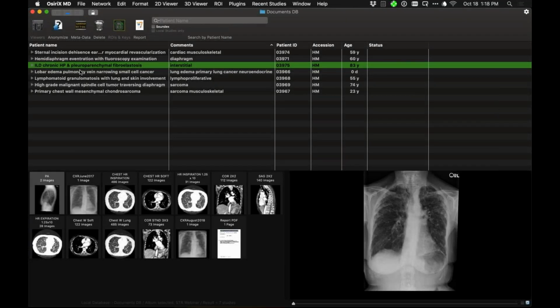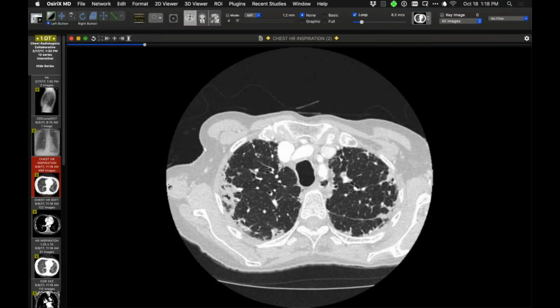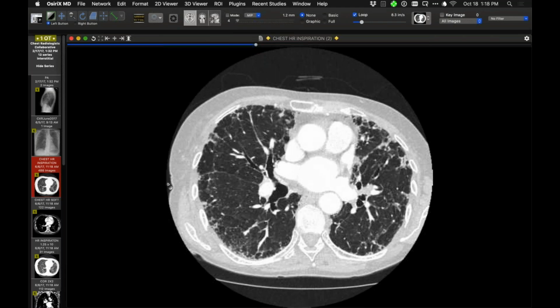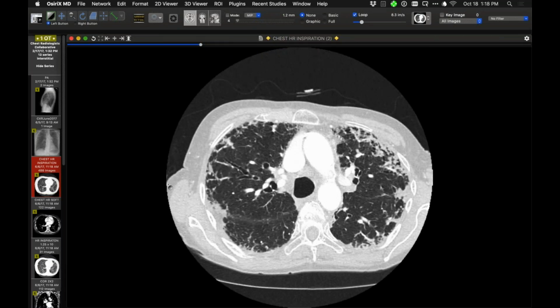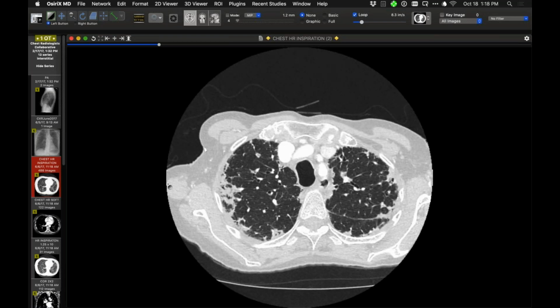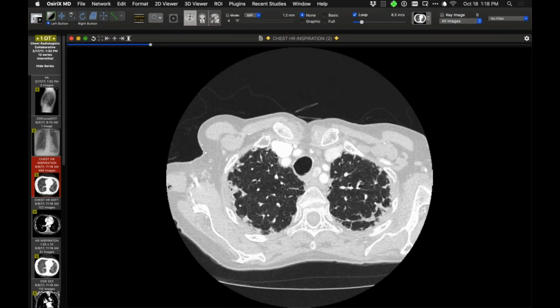You know, Howard, that's interesting because it's also been described with the UIP pattern, seeing the PPFE admixed with it as well. Yeah. It may be part of the same type of injury, and we just see that pleural involvement more for whatever reason. The other thing we think about would be a connective tissue disease with the pleural involvement, but I agree, it looks like HP, and you've got path that supports it. Yeah, exactly.